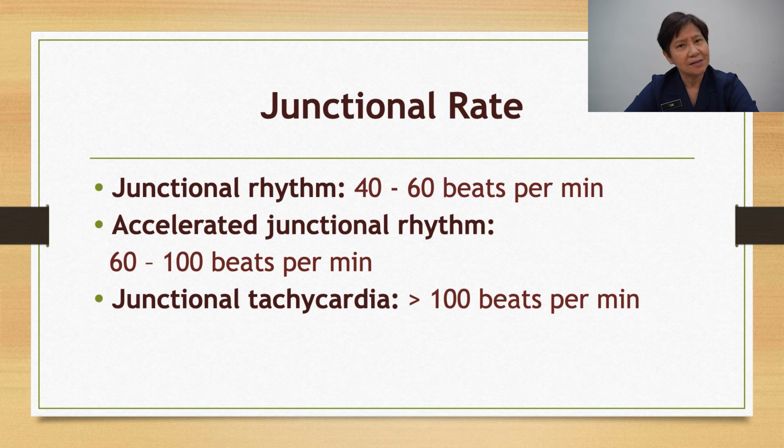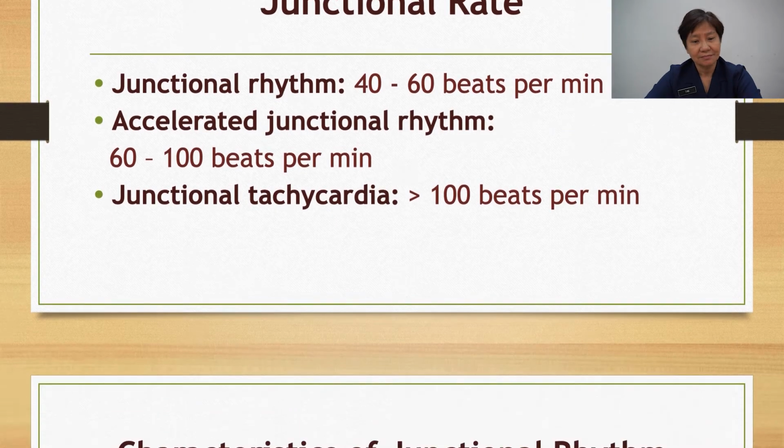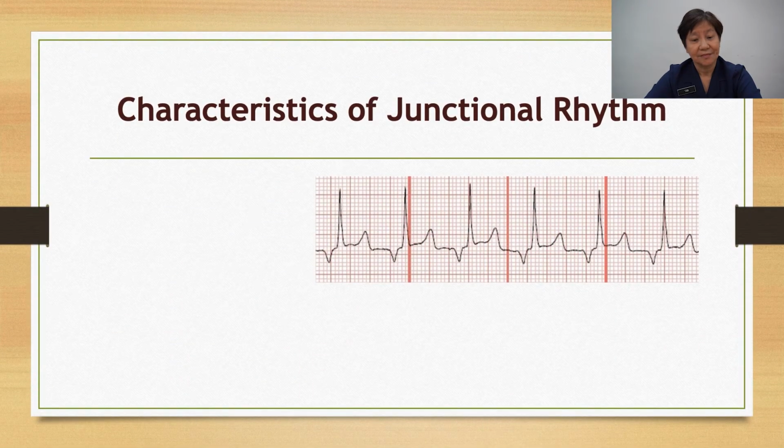How to recognize this pattern? We have a few characteristics for you to learn. Okay, first, can you see what happened in front of your QRS? There is an inverted P wave in front of your QRS.